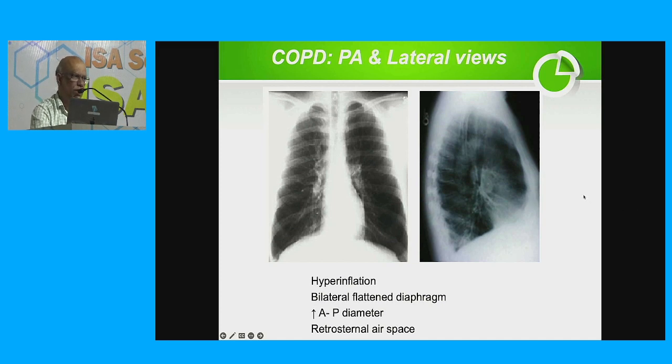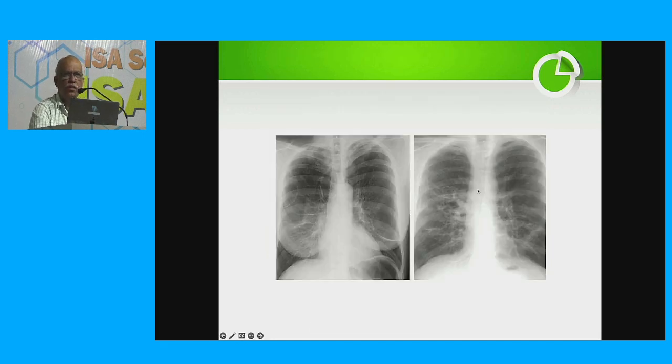This can be a spotter, OSCE exam question, or clinical case discussion, whichever way. You should be thorough with these X-rays, COPD. Can the next batch identify or make a spotter of this? Make it a little difficult. Two different X-rays.